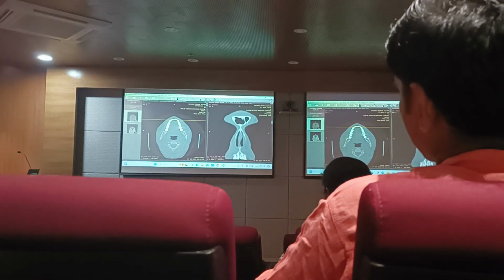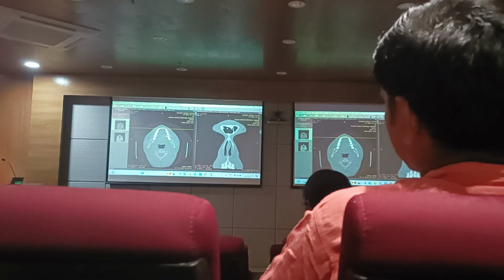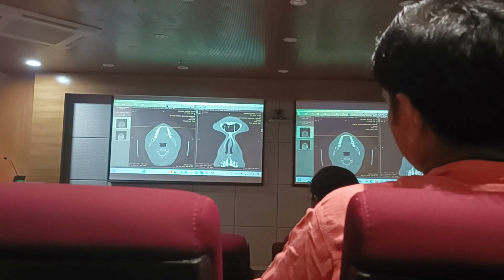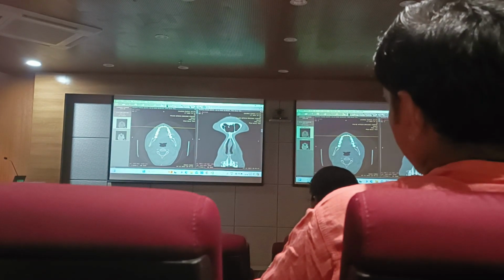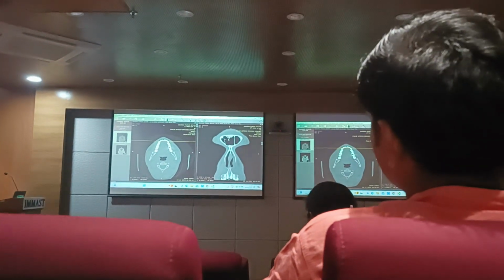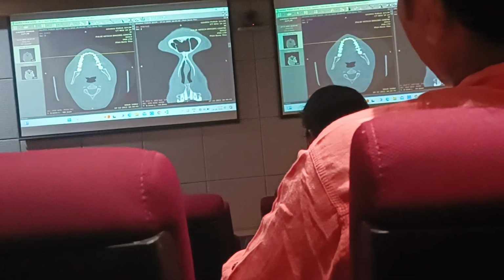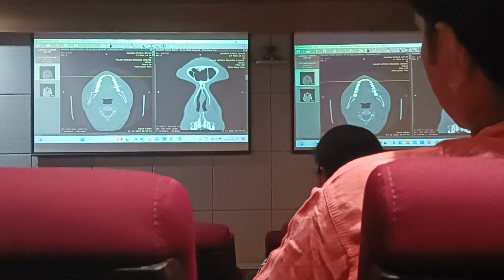The frontal septum. What is this and what is this? It's a right and left frontal. Right and left. Okay. Do you know whether it's right or left, or is it just a septation? You don't know, right? Septation. But there are septations within the frontal sinus, right? So you see this? What is coming up here? Frontal beak, right? Frontal beak.